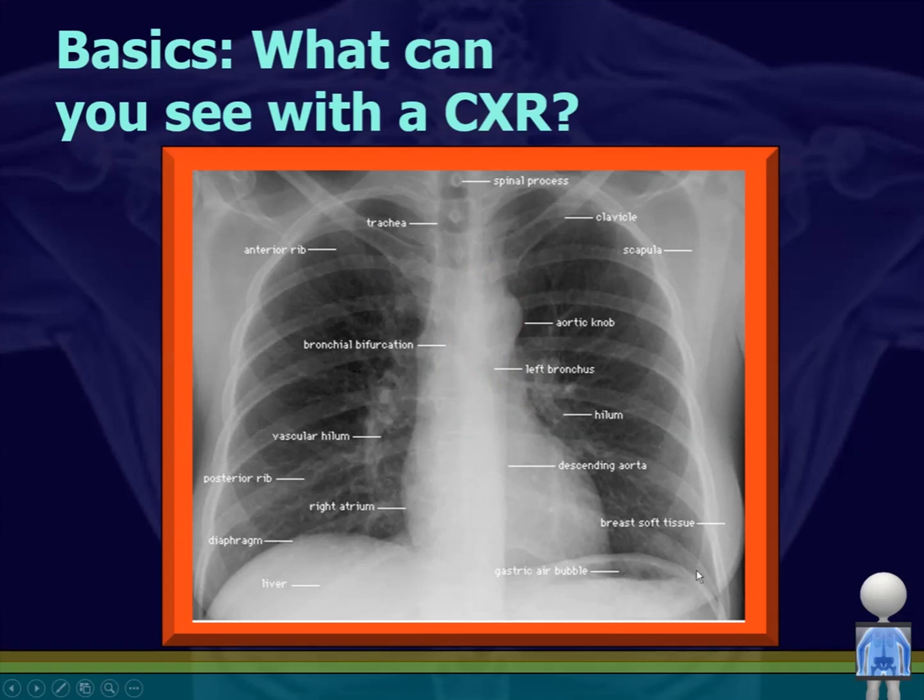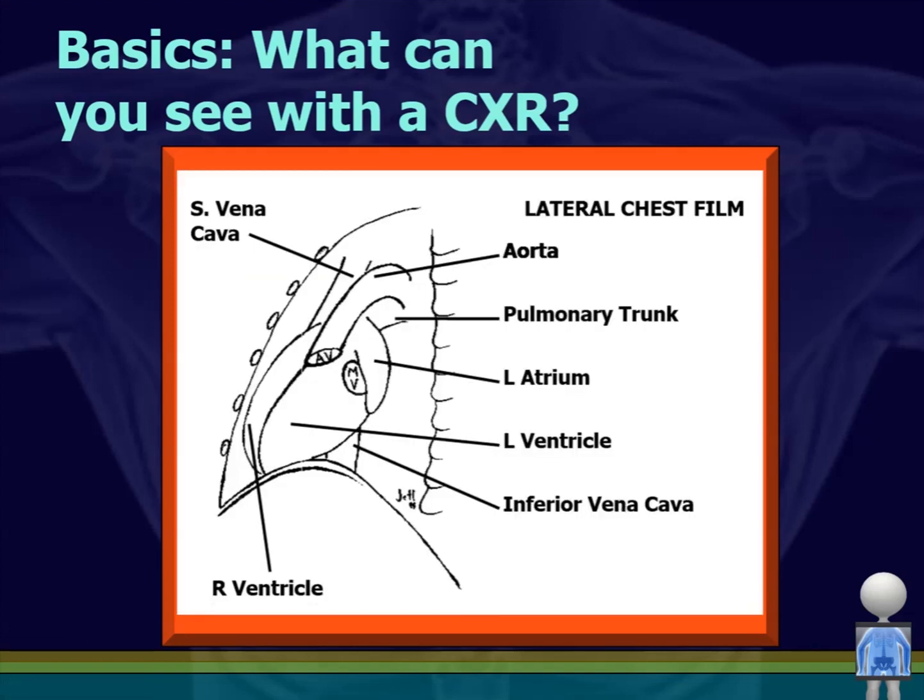I can see the diaphragm. I can see the gastric bubble in the stomach very often. I can look at the whole lung parenchyma. So there's a lot of things I can look at. So we're going to talk about this stepwise approach and why it's so important.